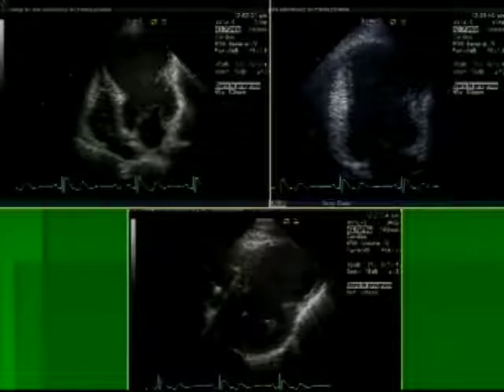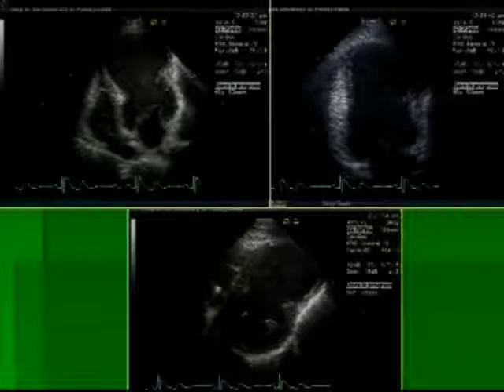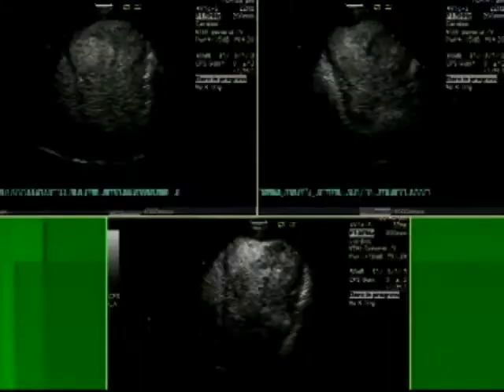If this patient had had a gastrointestinal bleed or some other reason why it would be dangerous to anticoagulate the patient, although we'd like to, it would be important to know if there was in fact a thrombus and anticoagulation was absolutely necessary, and also give us more information about the characteristics of the thrombus. And this is where contrast comes in.